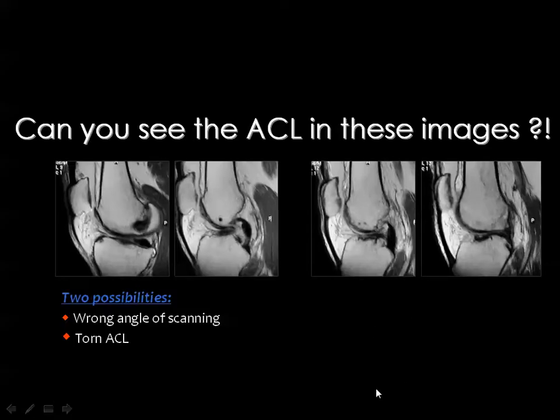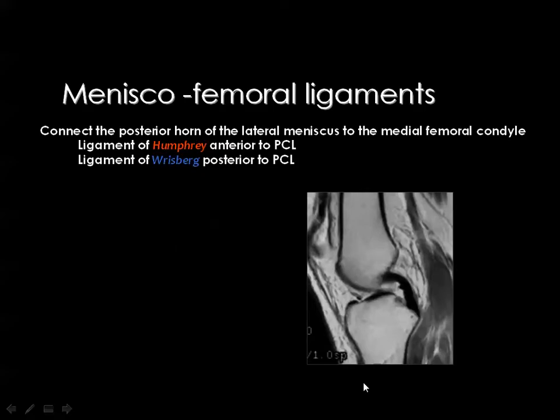In the previous days, we used to get back the patient and re-examine him, correcting the angle. But nowadays we do not do these maneuvers, and we go directly to the coronal images, as I will show you.